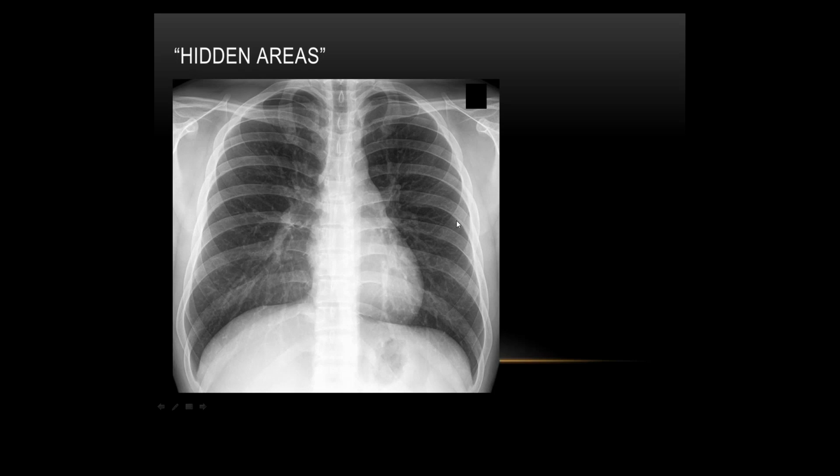And if they just had a drink or they've had some food, the hiatus hernia can condense, it could look like a tumour. So in those cases, I'll say do a lateral because then it just gives us the answer straight away. It's quick, it's cheap, it's easy to do, and there's less radiation. So in those cases, I've used it.